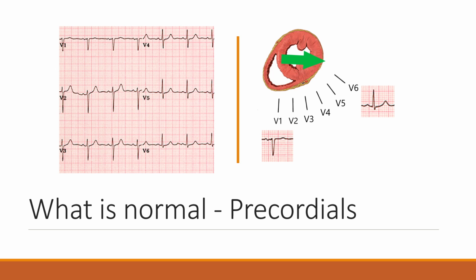Now, of course, the right ventricle depolarizes right towards V1, but you can kind of see there the cross section of muscle tissue. The right ventricle is very, very small in comparison. It's producing minimal electrical activity. And so all the EKG can show you is net electrical flow. So if I was really to map this out, I really should put a bunch of little tiny arrows moving towards V1. That would be the right ventricle. And then a bunch of big arrows moving towards V6, and that's because the left ventricle fires from right to left, and it dominates the EKG in an adult patient.